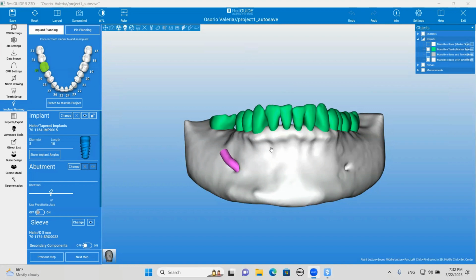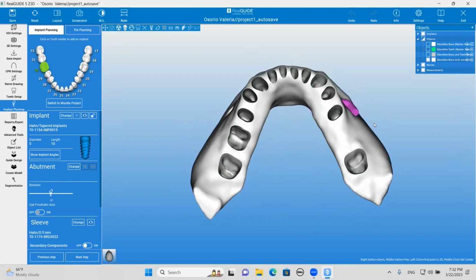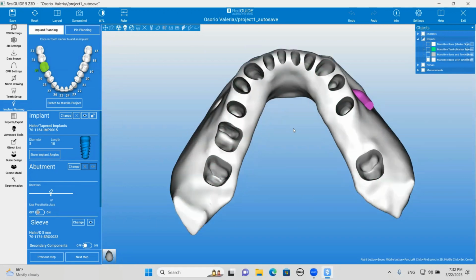So here we are. Okay, Jimmy, let's do this. Hussein, let's look at it from the occlusal, and let's get rid of the teeth. Jimmy, if you saw the first case that we just did, see how invaginated that was? Yours is not that bad at all. It's most likely because you did a nice job on the graft here. It was a 5-wall socket, you treated it correctly, and you maintained that bone. So let's put the teeth back in.